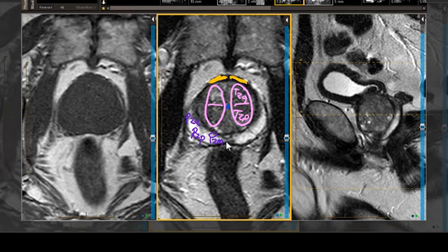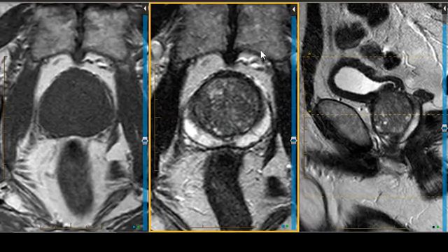And then we run into our little indentation, our little raphe in the midline, which sometimes can have a little linear low signal associated with it, or a little nodular low signal, but smack dab in the midline, not diffusion restricting, and not vascular. So we're going to have the same anatomic designations on the left side as we do on the right. Let's go down, shall we?